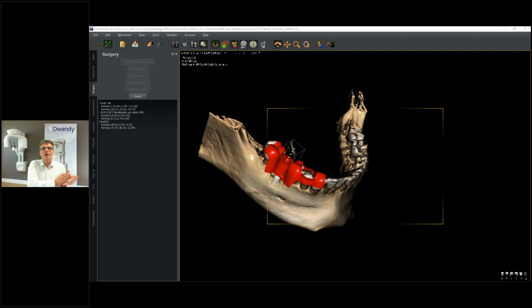Okay, then you saw from the very beginning, from scratch, the tour of the patient with the 4 actions. Remember, 1, 2, 3, 4. How to draw the canal, how to do measurement, how to draw a curve along the arch in a way to have 1 millimeter stamps. Also to call an STL file from a camera or from a plaster model. And remember, we may also have the STL file directly from the CBCT. We get the CBCT, and then we just create the object in a way to have the STL file of it, in a way to align.